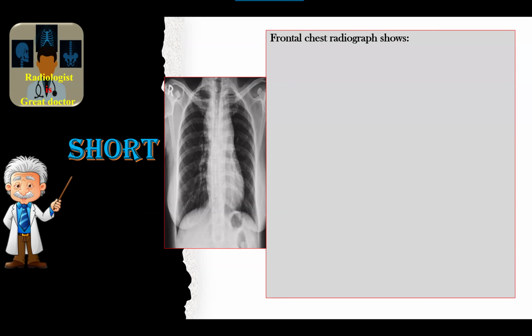If you are not sure about positive or negative, don't mention it. No calcification in it. Good. No mediastinal shift. So the final diagnosis is the remaining. We will go step by step.